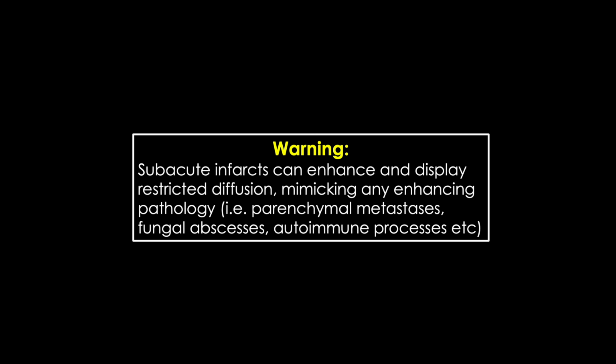One last little warning here. Always keep in the back of your mind that subacute infarcts can both enhance and display restricted diffusion, and can therefore mimic any enhancing multifocal pathology, the most concerning being things such as parenchymal metastases, fungal abscesses, or autoimmune processes. I've seen cases in cancer patients called metastatic disease when in fact it turned out to be subacute infarcts, and you do not want to change someone's cancer treatment on an incorrect diagnosis.